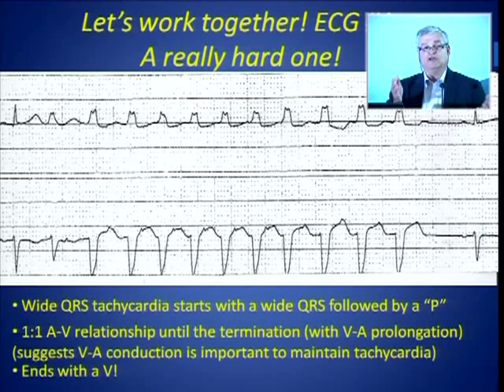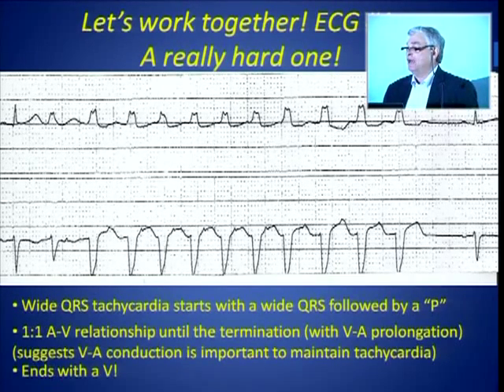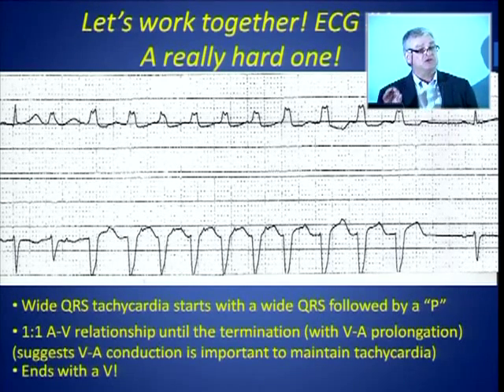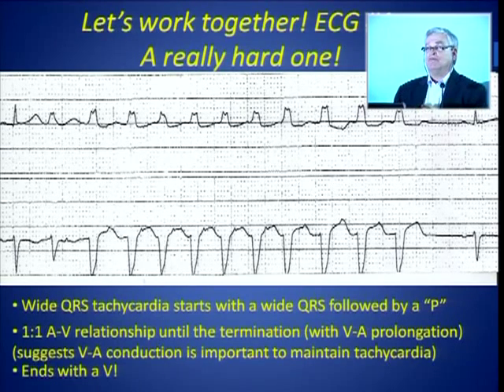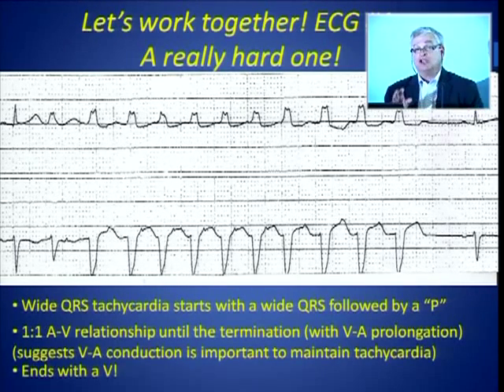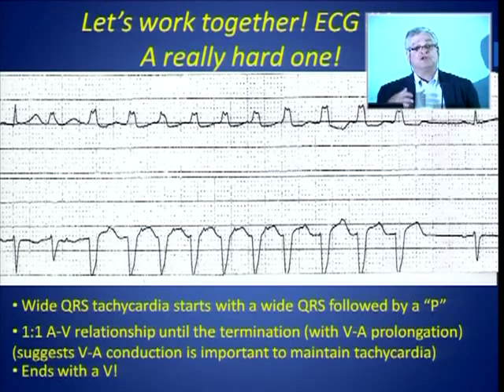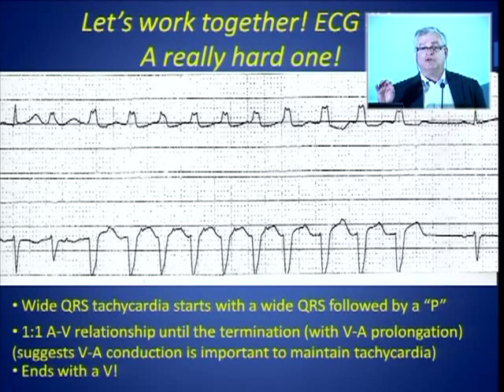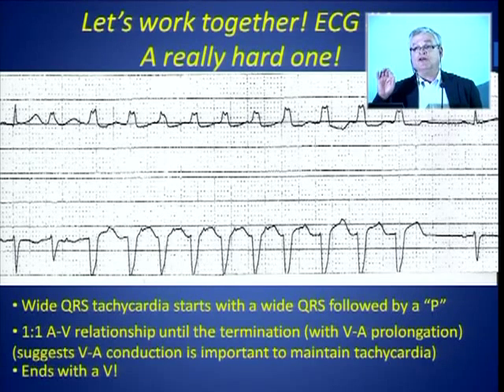I don't expect anyone to look at this and say, oh yeah, that has to be that. All I'm showing you is that by making simple observations and descriptions, you can sometimes come up with exceedingly complex ECGs. This is a very complex ECG. I show this to electrophysiologists who, like myself, have been practicing nothing but electrophysiology for more than 30 years, and we all stumble on it. But the point is, if you have a system and you take a systematic approach, you can make even difficult ECGs fun, interesting, and you might actually get it right.